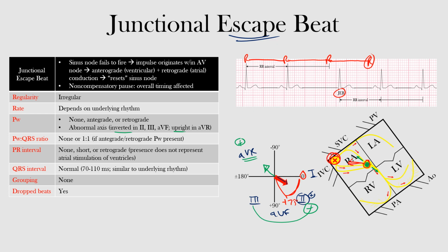And doing so, it will either fire at a similar rate that it was previously or reset it. So you pretty much have a reset going on here as it travels back, and notice our sinus P wave is firing again, and it may be at a different rate. So it's resetting what it was before, and either those intervals will be the same or it can fire at a different rate in different intervals. Hopefully this is making sense.